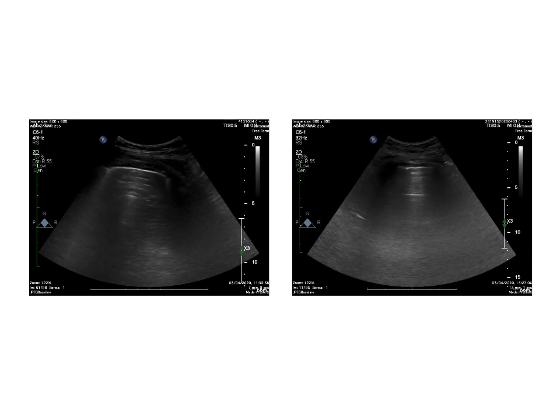And also, when we looked into this same patient's lung with the curvilinear probe, you could see the resolution of the alveolar edema, and you could barely see a few B lines peripherally, but most of his lungs showed abundant normal aeration of A lines. You see the pleura here and these horizontal mirror-shape artifacts.